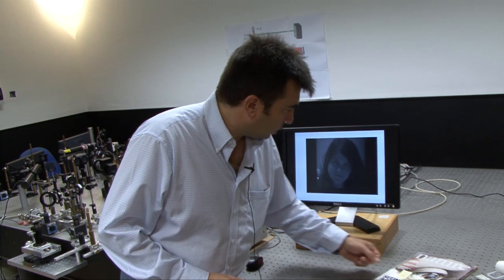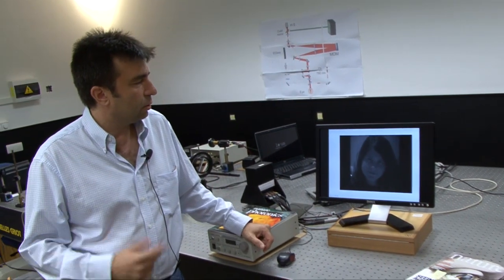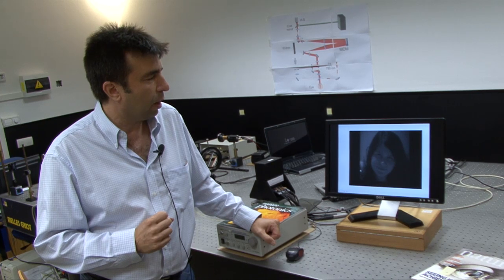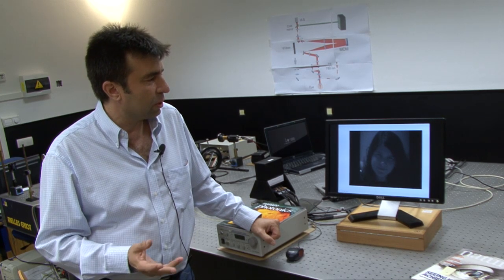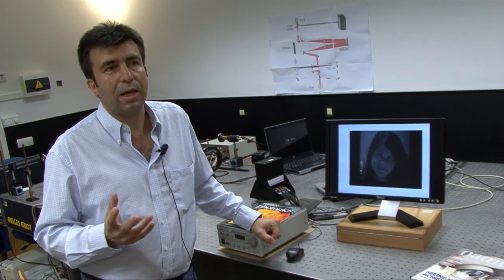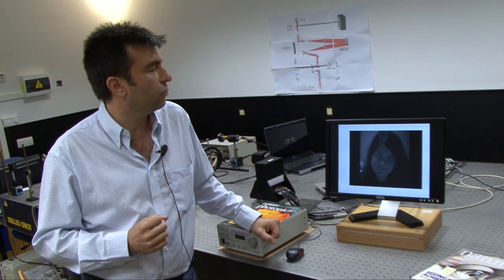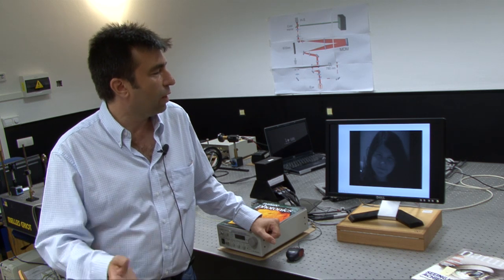There are many other situations where you can use this instrument to really simulate how other people are seeing. What is the interest? Well, it's a lot of fun because we can understand how different people are seeing. You can put yourself in the shoes of your grandfather or your neighbor.